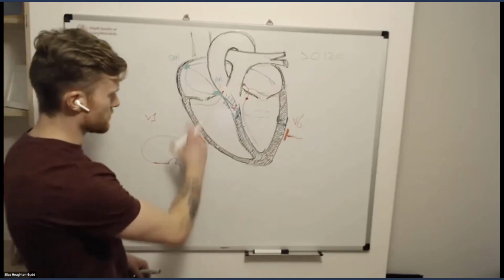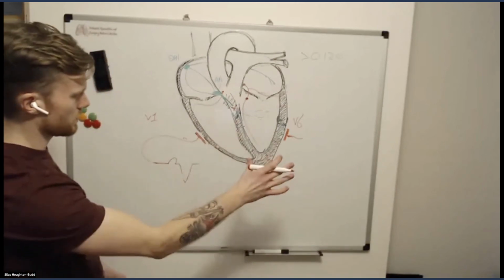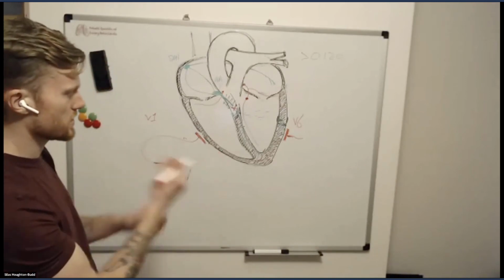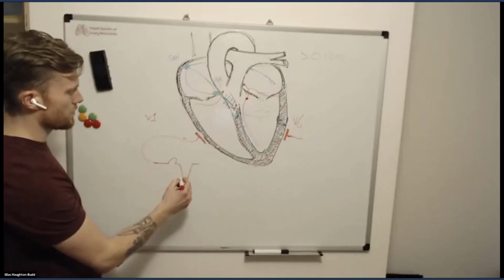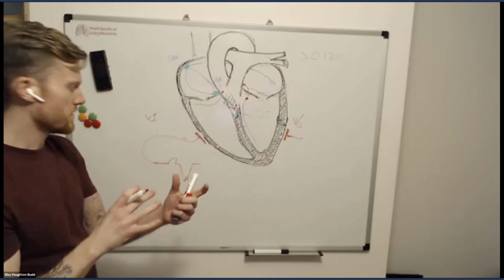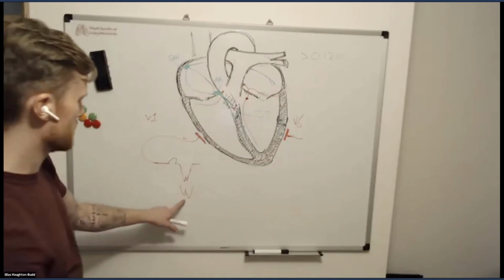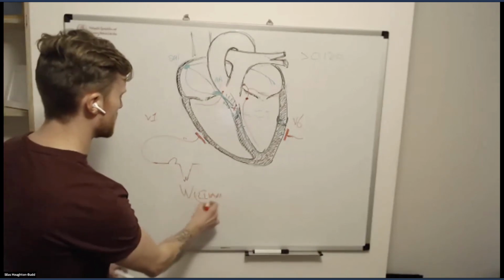And so we don't really have this big wave of normal function in the left ventricle because that whole system is taken out. Sometimes we get notching, sometimes we don't, depending on the intricacies of that individual patient's conduction system. People will recognize from that potentially this method of remembering, William and Marrow, and this W is so that method is William has got two L's.